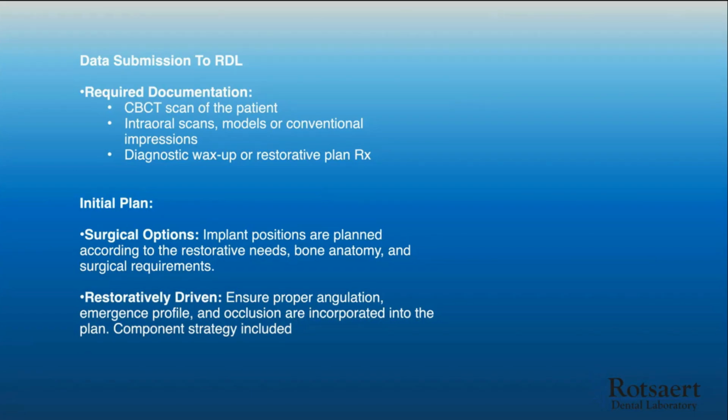meaning you may want to do something on an immediate perspective, but we'll do that anyway in the sense of we always do a prosthetic design, and I'll show you how that's created. But we can pull that into the design software, determine exactly where the ideal setup is, just like setting denture teeth, but virtually. And we can then determine also the components that might be required from there as well.